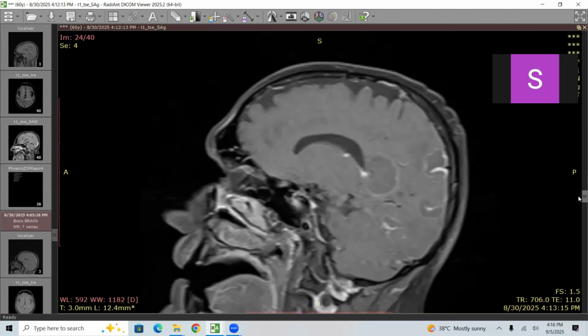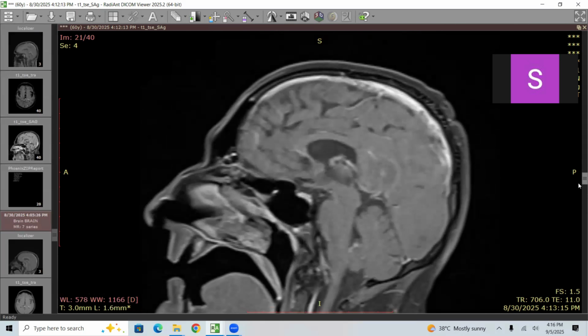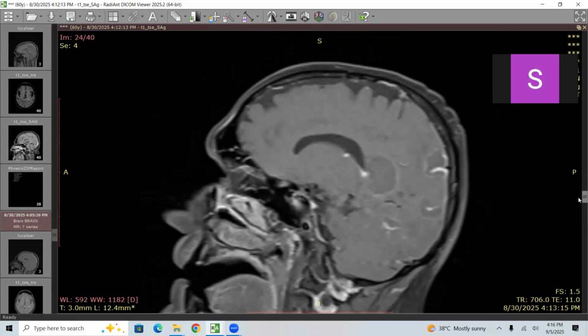You had said that if the patient is young, this could be acute ADEM, acute disseminated encephalomyelitis. But the patient is 60 years old, so ADEM is less likely. If there is any history of viral infection, then the patient did have a viral infection about 2 weeks ago and now presented with disorientation, fever, seizure. This is a case of acute disseminated encephalomyelitis.